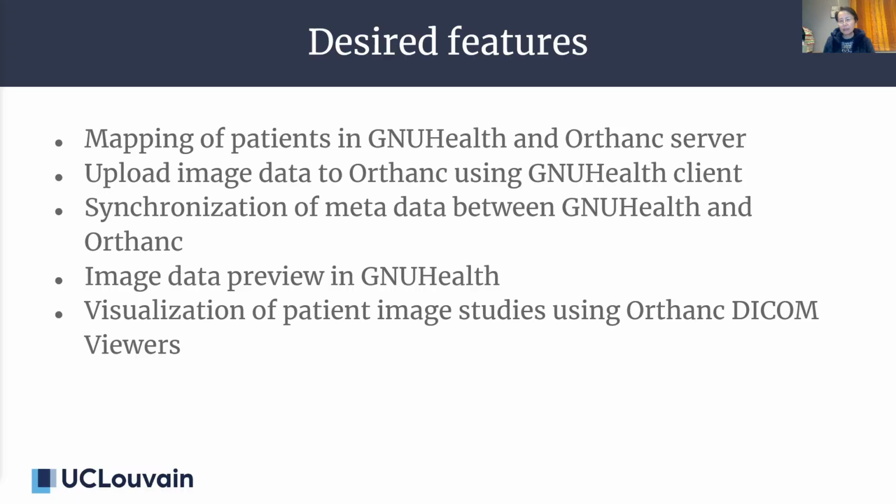Uploading image data to Orthanc using the GNUHealth client, synchronizing metadata between GNUHealth and Orthanc, previewing image data in GNUHealth, and visualization of patient image studies using the GNUHealth Orthanc DICOM viewer.